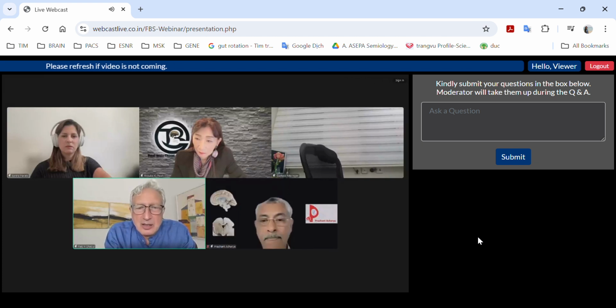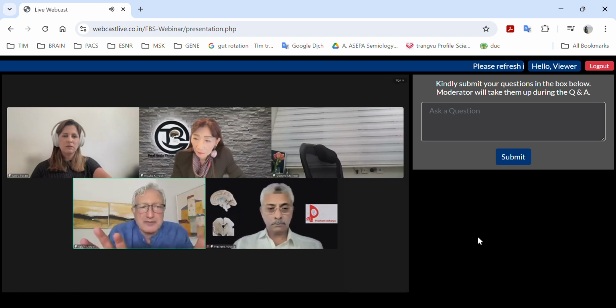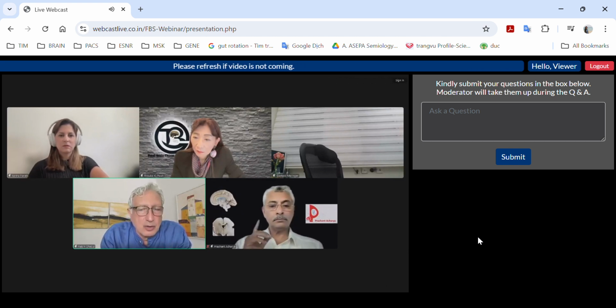Is there a need then to switch to go transvaginal? And if you are scanning transvaginal, as Srixoko is suggesting, you have an excellent possibility to compare two hemispheres. If you are scanning abdominally, the proximal one is hiding. So this is why, to the question asked, is it easy? If you don't have an additional hint, no.